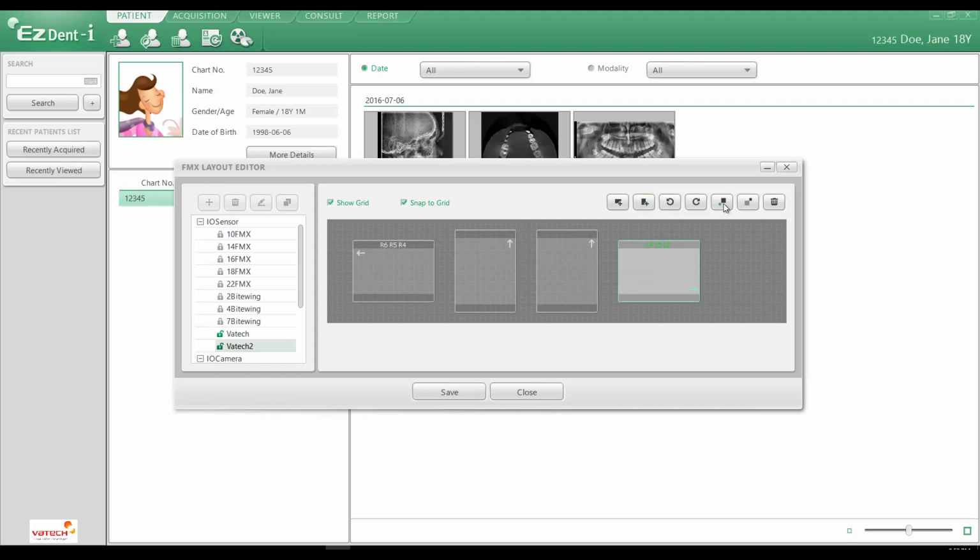Left click and orient it to make it more symmetrical. You can also enlarge these as well, strictly from an aesthetic point of view. Recenter them to make it symmetrical again.